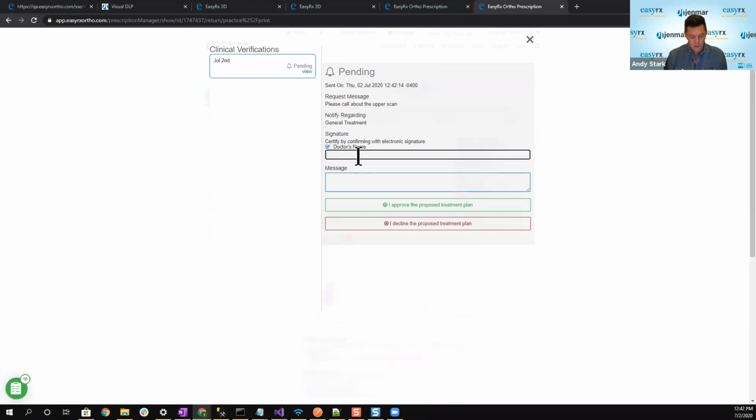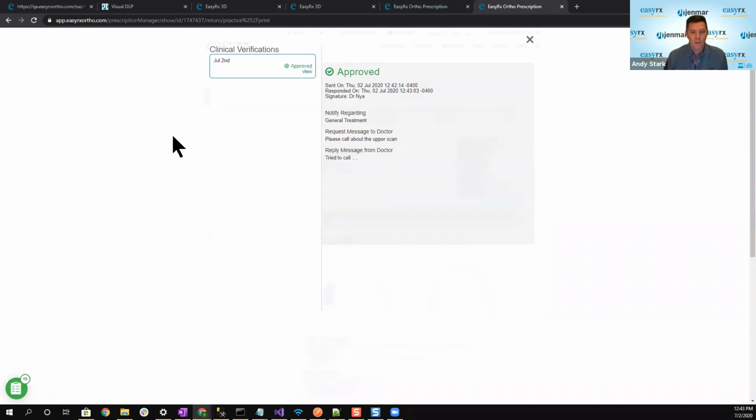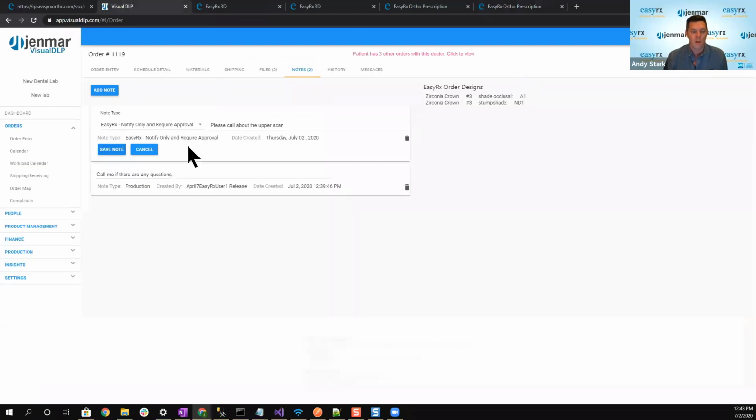So here they can then answer this, Dr. Nye, maybe tried to call, whatever the note, whatever the response is, or maybe you proposed a solution and you want them to accept or deny, or approve or deny that. So if they approve that, that will then submit that back over to VisualDLP, and that gives you that back and forth communication, and it tracks that all in the lab management system.